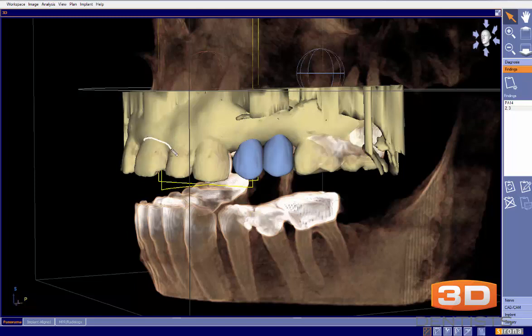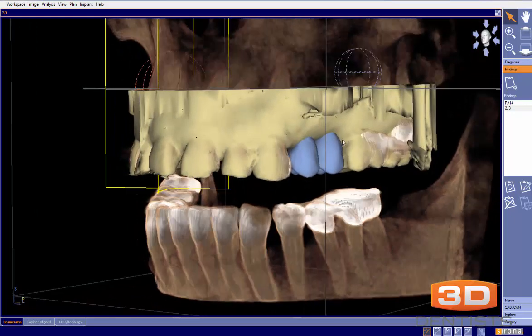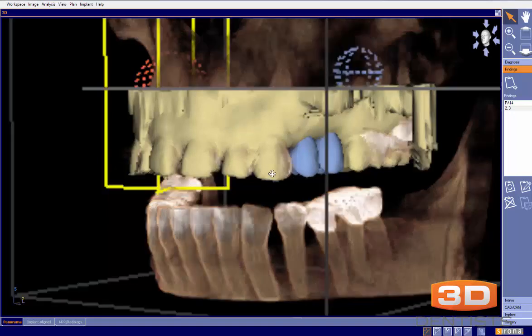So I take a look at where the margins are drawn, and that doesn't typically make sense, that these two would be different. I'd like to draw my margins a little bit more accurately, having them look more like what I expect my final restorations to look like. Now this may have a tissue defect where that is going to look like that.